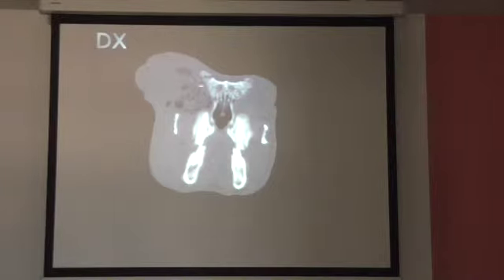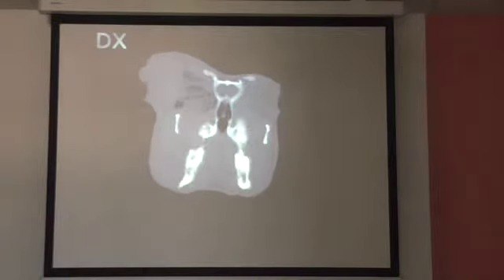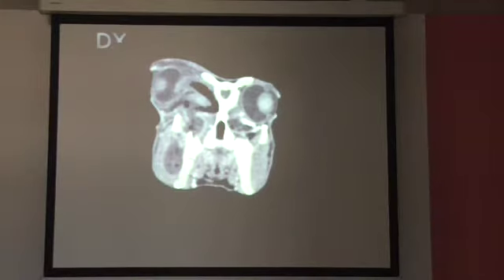And here is just the nerves and optical arteries here. So in this case there is a need to enucleate the eye. Here it is again on the contrast media.